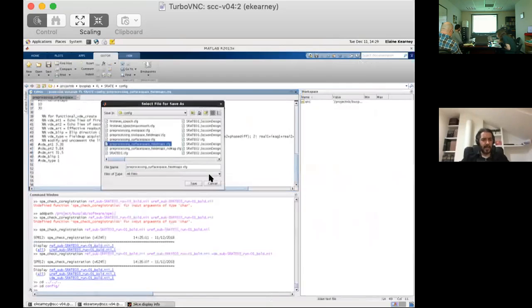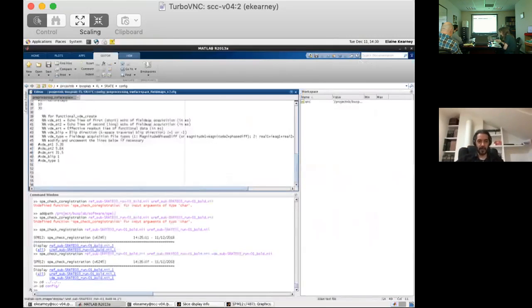And the echo time parameters are fine, right? Those we got from the DICOMs, and we're pretty certain that those are right. Yeah, and I checked them for every subject. It's just S-rate 1 and 2 that we weren't sure about the short echo time, but it was consistent for everyone else. Okay, so this is a little bit of trial and error, but if you don't mind just changing the blip directionality and seeing whether the images that we get are better or clearly worse, that will give us a little more or less confidence that we are doing it right or wrong.